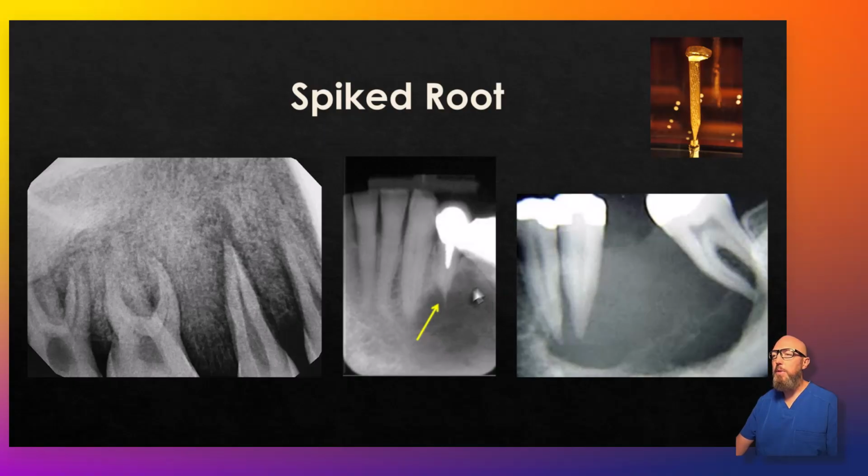This is some unknown malignancy. And classically, it's tough to distinguish between malignancies on radiographs unless you see that osteosarcoma appearance, and then it's one of the calcifying type of malignancies. So typically osteosarcoma, chondrosarcoma, breast or prostate metastases.